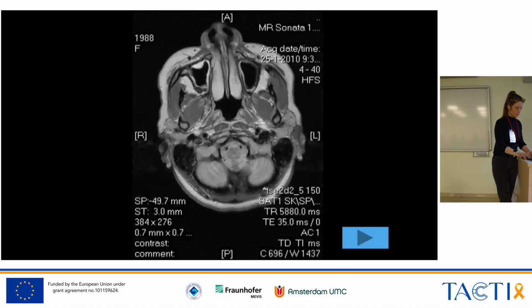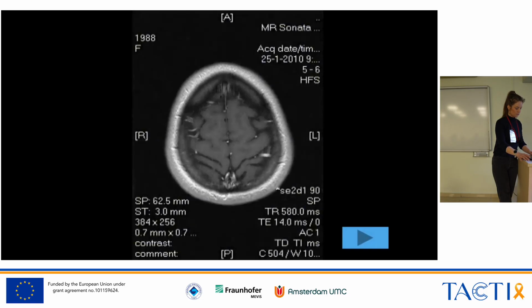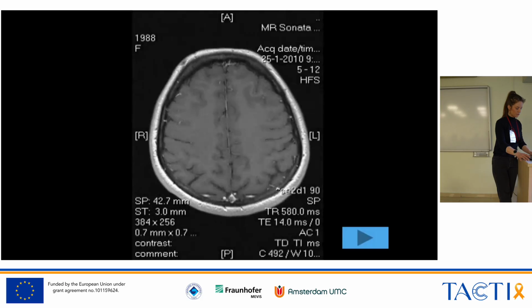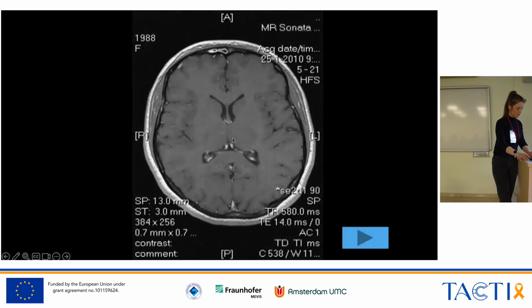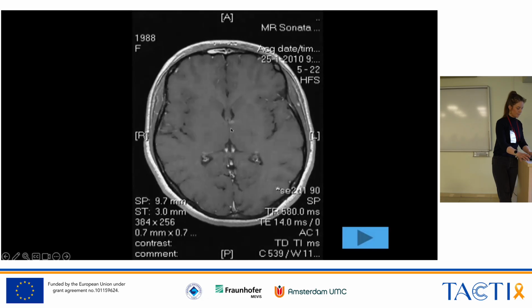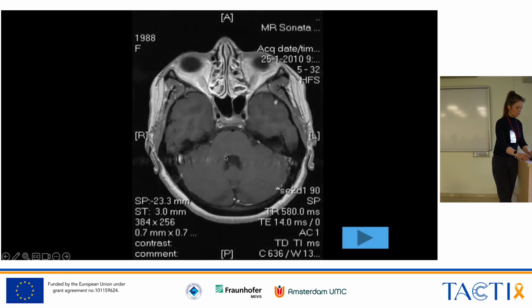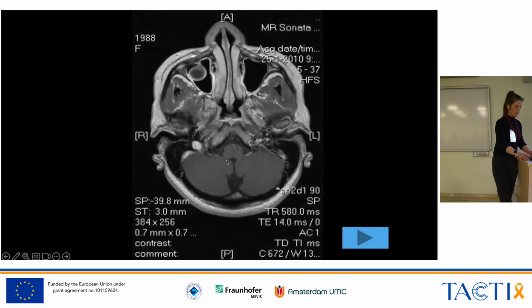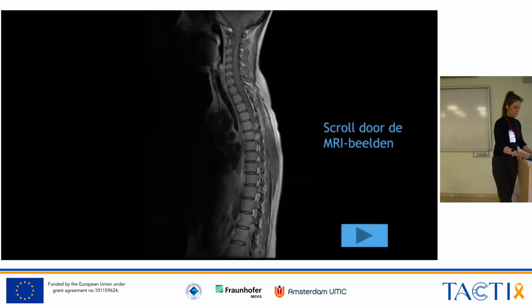And we also had the contrast scan, the post-contrast scan showed here, if I go down a little bit, enhancement here. And the bigger one here, infratentorial. So that is dissemination in space. And then, of course, and time, yeah.